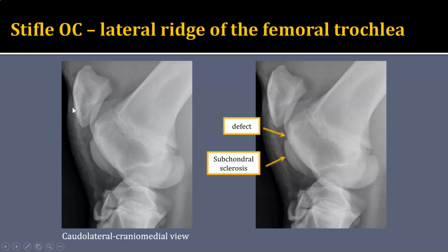So in this patient, there is some intracapsular soft tissue swelling of that femoropatellar joint. And then when I look at the proximal third to middle third of this articular surface of this lateral ridge of the trochlea, there is a large concave defect with subchondral defect and lucency. And this one seems to have some sclerosis in that lateral ridge.